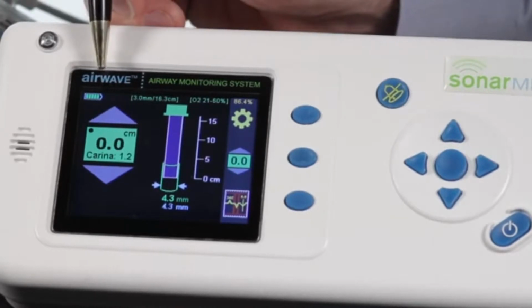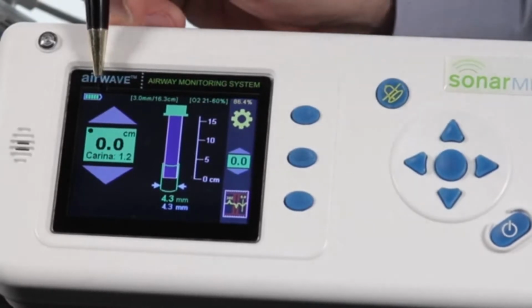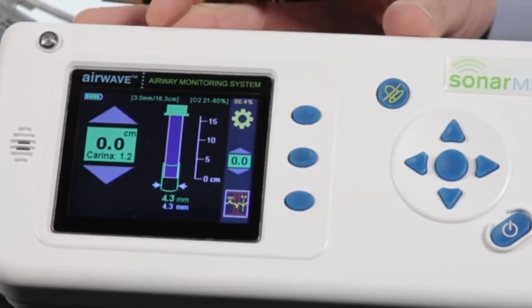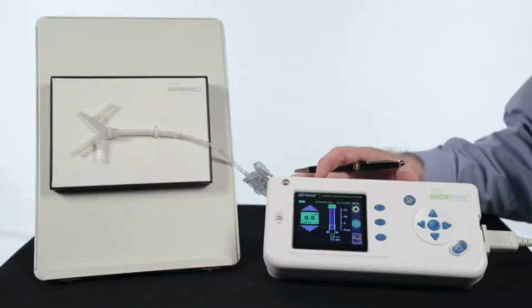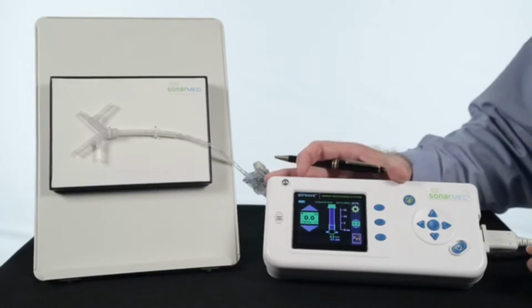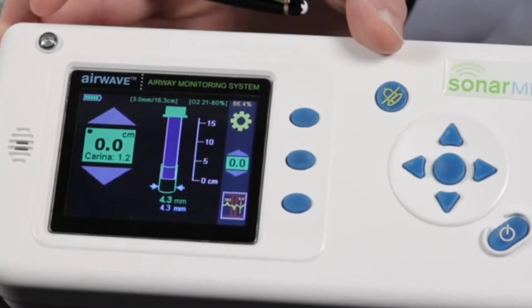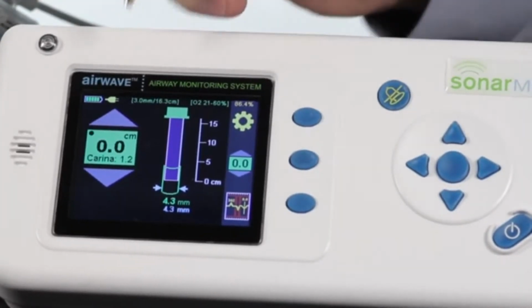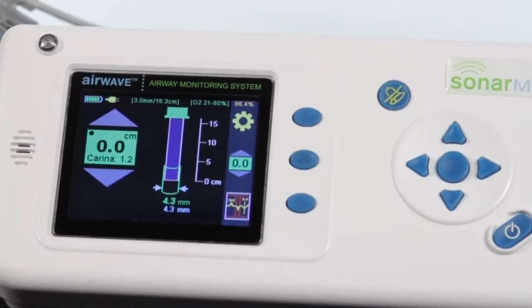You can see, first of all, we have a battery indicator that has several bars indicating battery life. A fully charged monitor has about 2.5 hours of battery. If you plug in the battery to an AC source, you'll notice that a yellow plug comes on to indicate that you are directly connected to a power source and not relying on the battery.